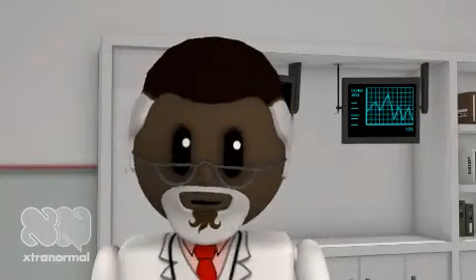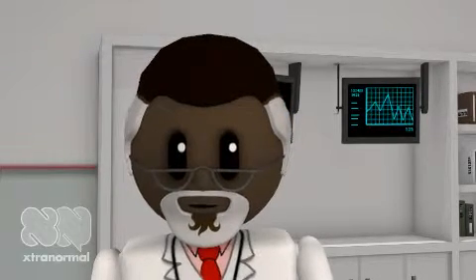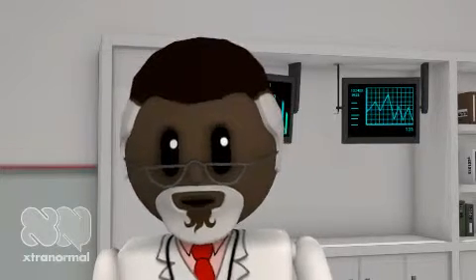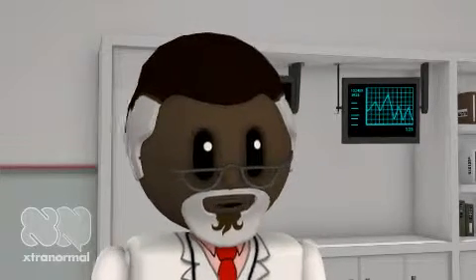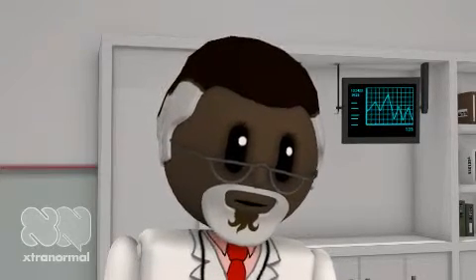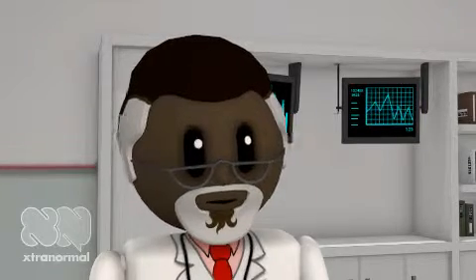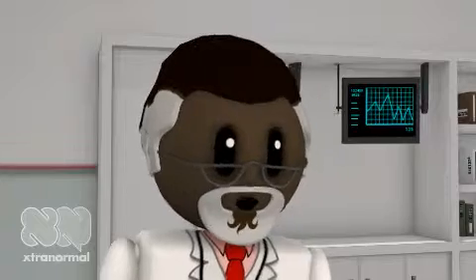Pressure targeted controlled ventilation. The inspiratory flow descends during inspiration to maintain the target pressure until the preset inspiratory time elapses. Flow volume loop illustrates a descending inspiratory as well as expiratory flow. Pressure volume loop demonstrates a smaller hysteresis compared to the volume ventilation with constant flow. The descending flow is responsible for the smaller hysteresis of the pressure volume loop.